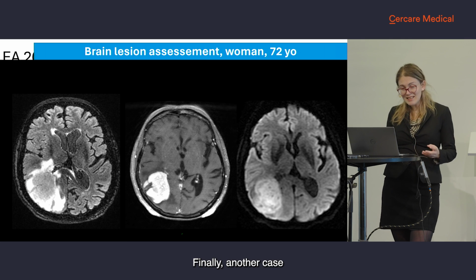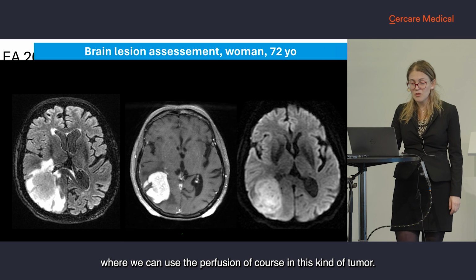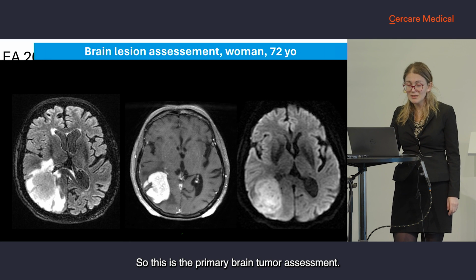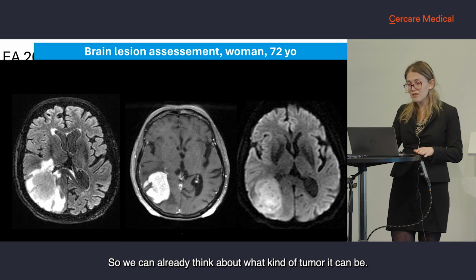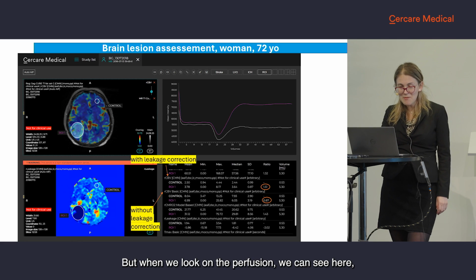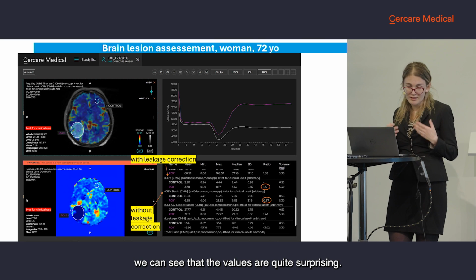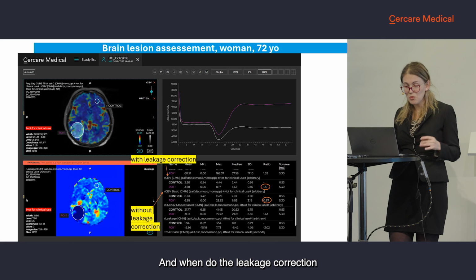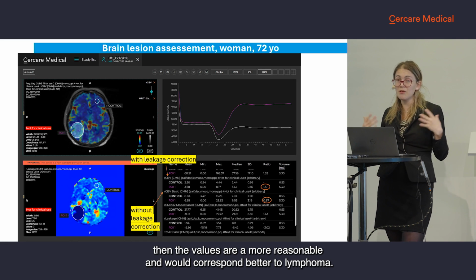Finally, another case where we can use perfusion, of course, is this kind of tumor. So this is the primary brain tumor assessment, and here we see this large enhancement with the diffusion increase, so we can already think about what kind of tumor it can be. But when we look at the perfusion, if we look only at the values without leakage correction, we can see that the values are quite surprising, and when we do the leakage correction, the values are more reasonable and correspond better to lymphoma.